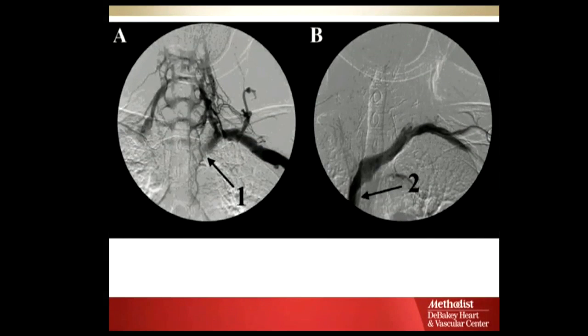What's going on here? So it looks like you can see the clavicles. I would say that looks like the left subclavian artery, vein. Oh, vein. Hard to know why I know that, but it's huge. First of all, it would be an aneurysmal artery.